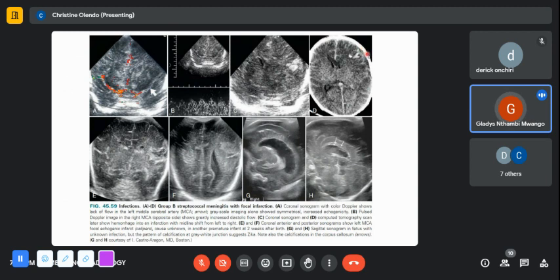And for you to pick that up, yes, there's something hypodense there. No, in fact, it's actually isodense, because the gray matter is a little bit denser, more attenuating. There's a collection there. And for you to have picked that up on ultrasound, you needed to have done axial images through the temporal bone.